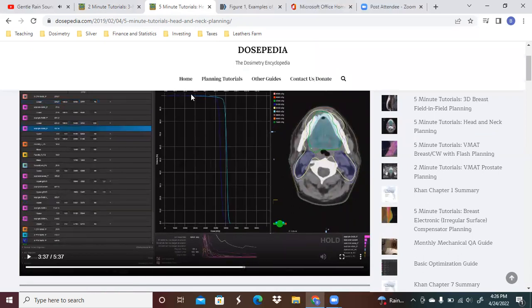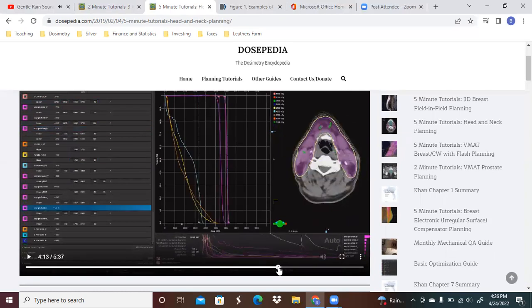Then once you hit the optimize button, it goes ahead and it tries to figure out exactly how to accomplish this. This DVH right here shows you how well it's doing. It'll show you, maybe you've got the target structures and they're covering things really, really well. And the normal structures, if they were turned on, might descend over like this, or they might kind of creep along the side here or whatnot. It kind of depends on what type of structure it is, where it is, and how closely the isodose line is going to try to wrap around that particular structure.